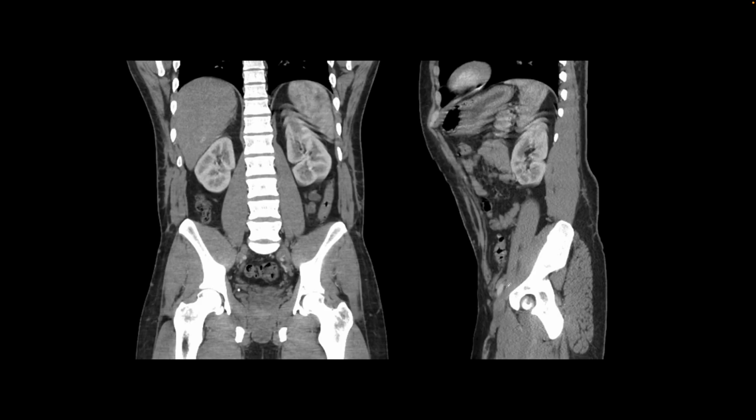Here's our next patient. We performed a CT abdomen and pelvis with contrast to look for a cause of abdominal pain, and the patient moved during the acquisition, because of which we see this step ladder appearance involving the superior pole of the left kidney. And also on the sagittal image, we find that the images are limited in the upper abdomen right there with these artifacts. So this is characteristic motion artifact on CT.